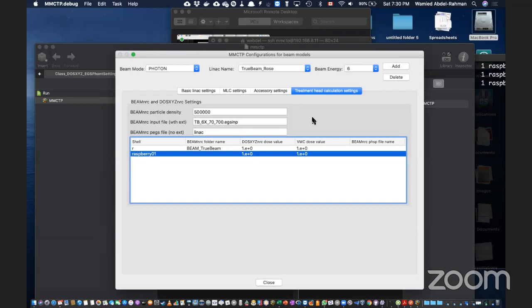Andrew is probably going to come soon, but here, this is my shell. You will find this thing blank. We need to enter the directory for my beam.